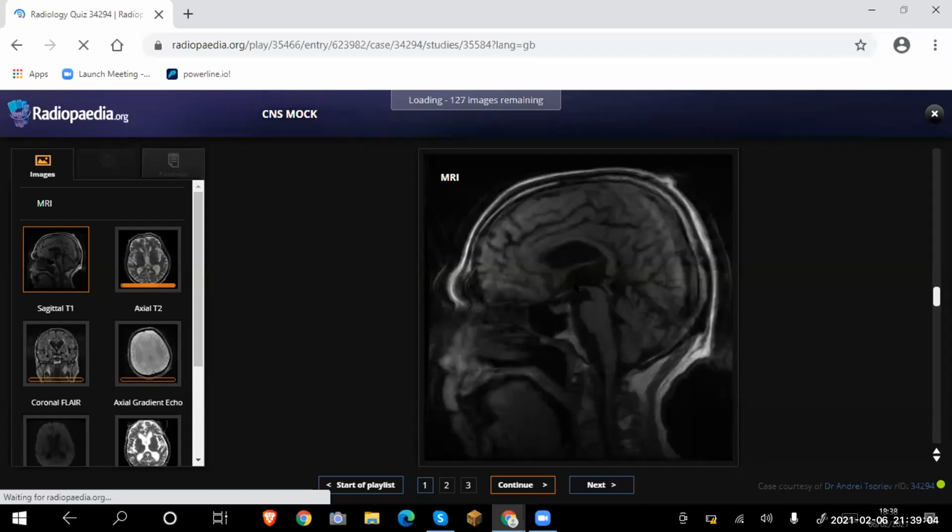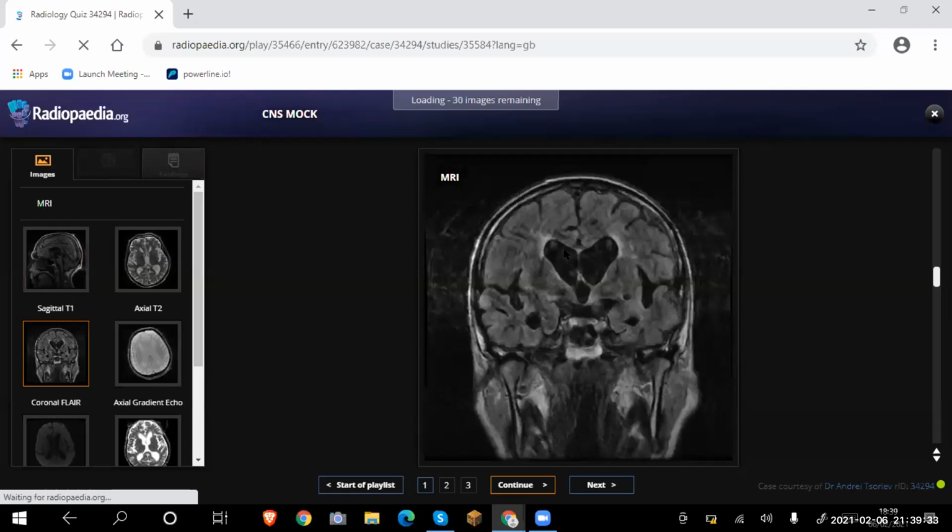And in this case also, you mentioned that there's no transependymal seepage. There's actually some transependymal seepage, and that is why they need to have a shunt in place, or else they will continue to deteriorate. So we need neurosurgical referral, because we can see this hyperintensity in the periventricular region that is suggesting that there is some transependymal seepage. So they need to be shunted. Okay, thank you.